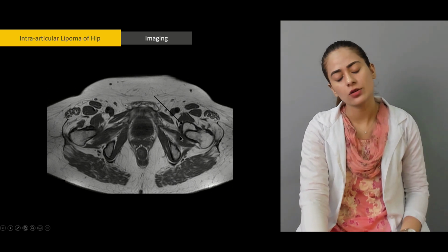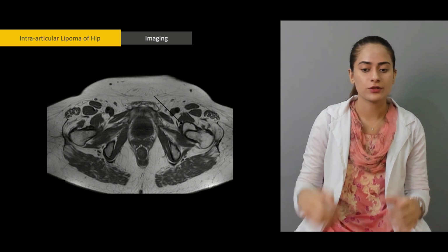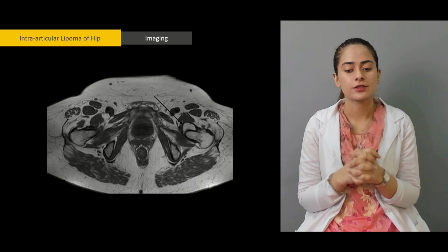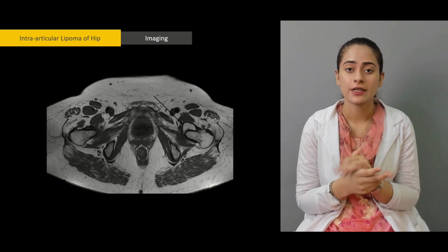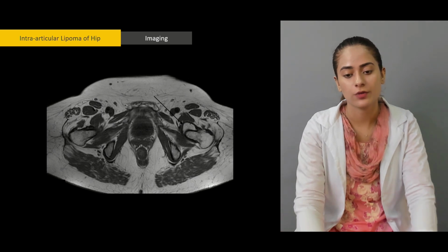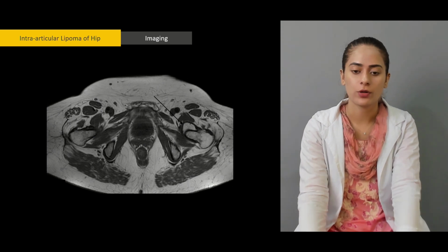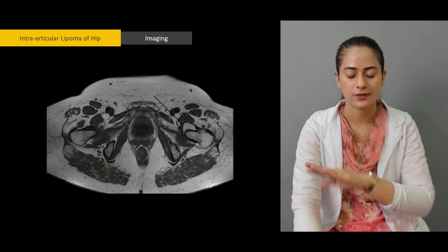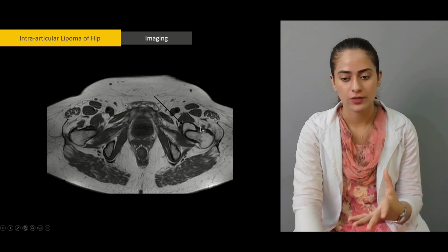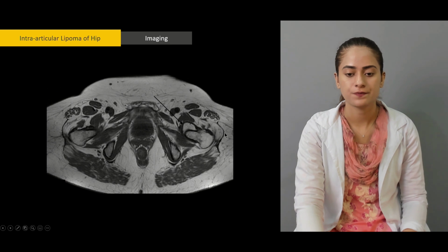So then you suspect, and then you look at it, and you do certain other sorts of tests, and there's also history and other things as well, and then you suspect a lipoma. If it turns out that these are fat cells, then it's a lipoma. So this is how you differentiate something that's abnormal by comparison. This is actually a cross-sectional image, right? This is actually the femur here. So it's actually inside, right next to it.